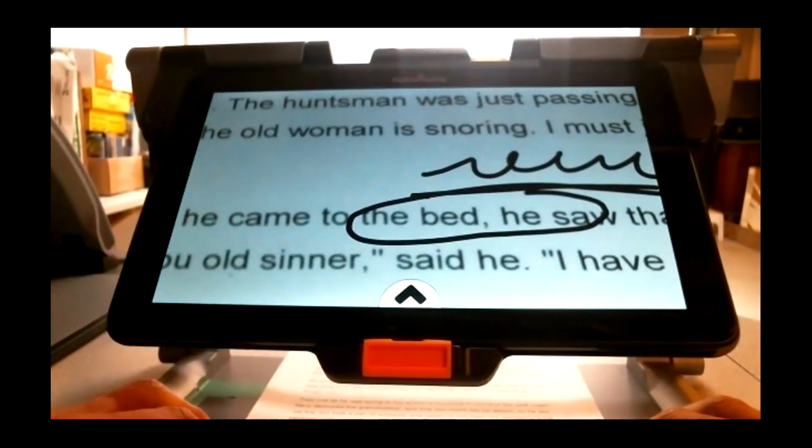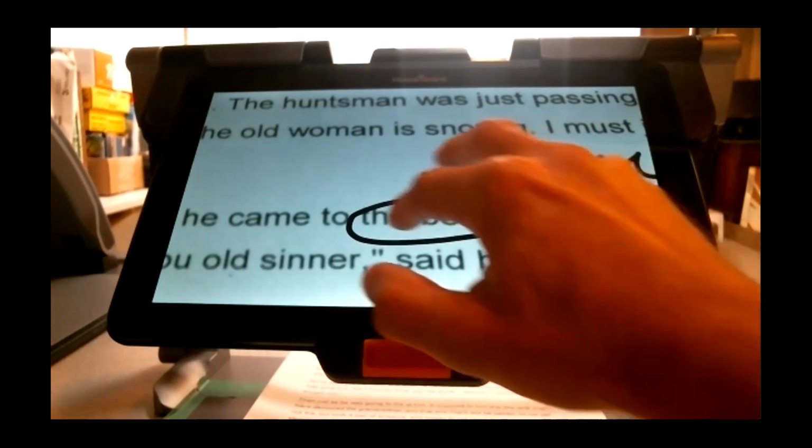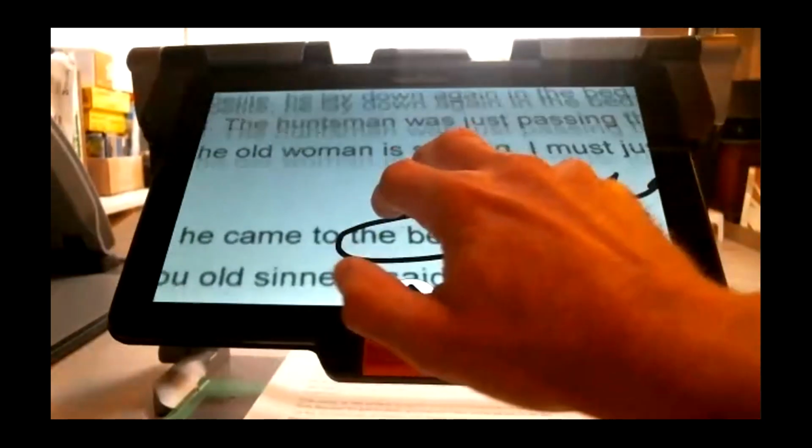It works a bit the same way as Google Maps. I have an Android phone and I use Google Maps a lot. I love it, and you can do that. You can increase the zoom while at the same time panning to where you want. So the same kind of procedure applies here. To pan or zoom, use two fingers on the screen when you're in the edit mode.